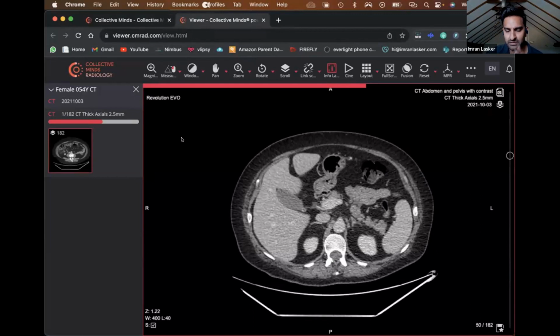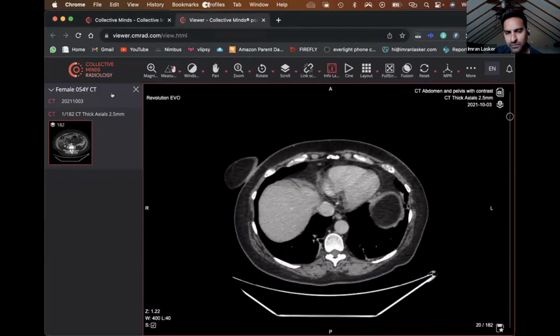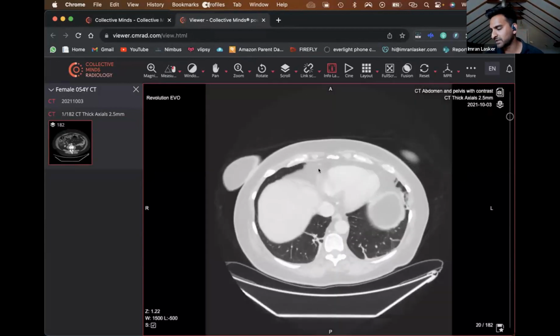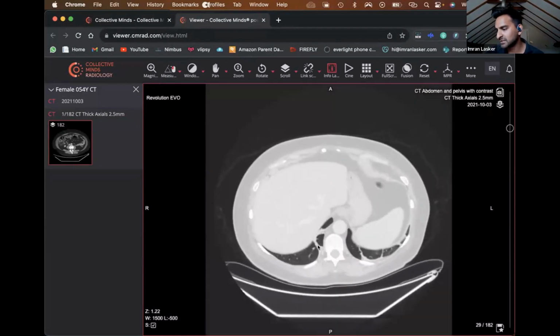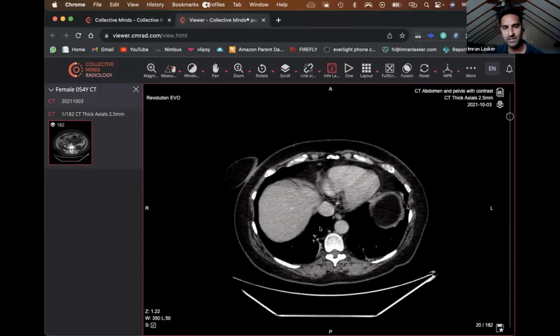Appendicitis, I'm going to show you the appendix for those people that may have thought it was appendicitis in just a second. So let's go to the CT scan. We'll go from the top and feel free to put your answers in. Since we've been talking about lungs again, let's have a quick look at the base of the lungs. You can see there's a linear, cobweb-style appearance. Can you see that? When they look like cobwebs, you're thinking this is bands of atelectasis rather than anything else.